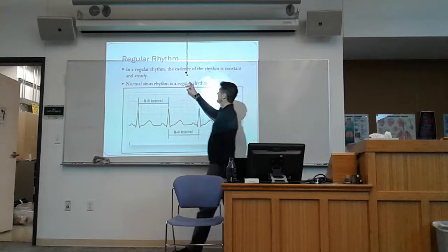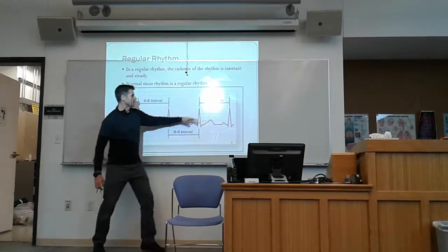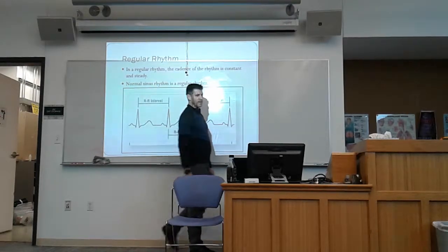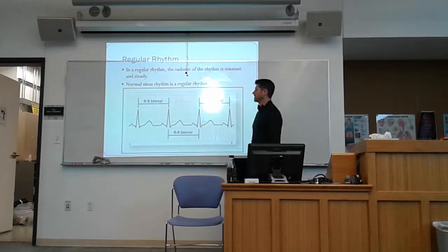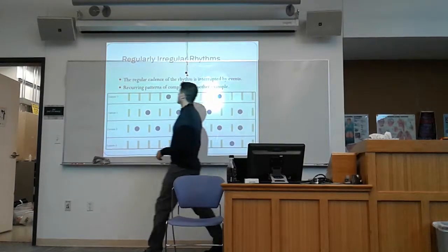So on a regular rhythm, I'm looking at the cadence of it. All the R to R's should match and be the same size. All the P to P's should match and be the same size. Good? Okay, so take a moment and think for a second.